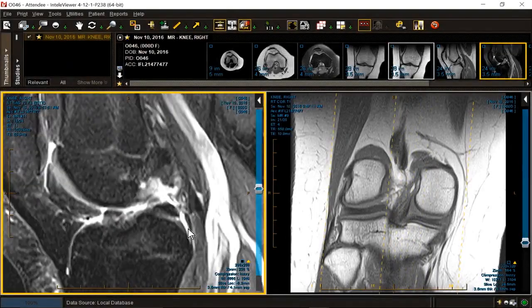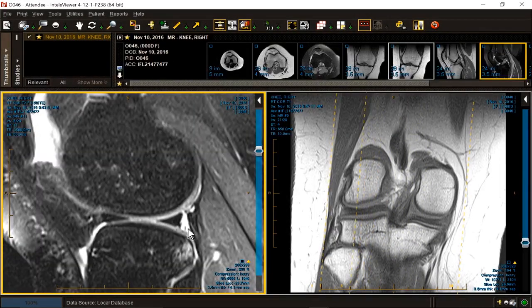How long will that signal persist? The signal will go down. It'll be less bright, but the actual signal will persist forever. So if somebody re-injures their knee and you see vertical signal in the back, to decide whether that signal is new or old, you have to look at its intensity, because this will fade to gray but still persist throughout life as a scar in the meniscus, but still be stable. And that's contrary to what was taught 15 or 20 years ago.